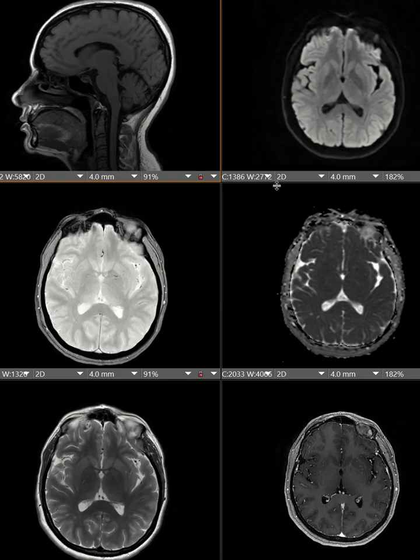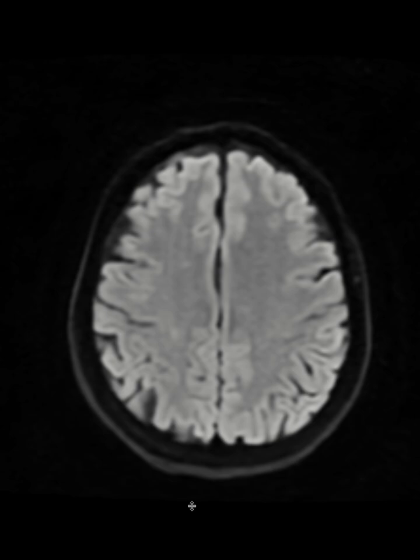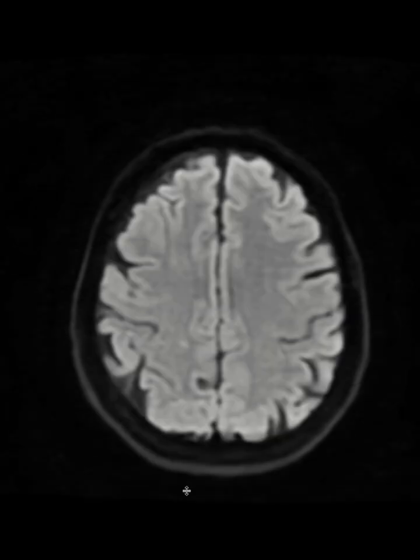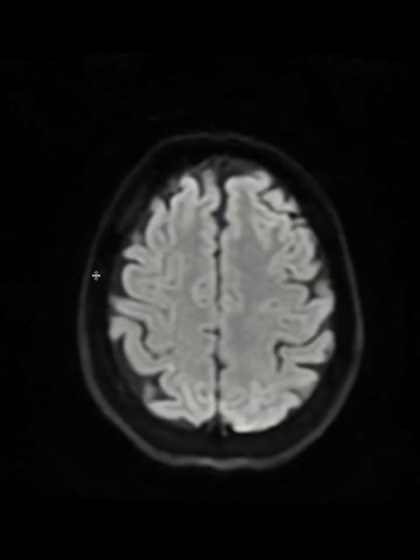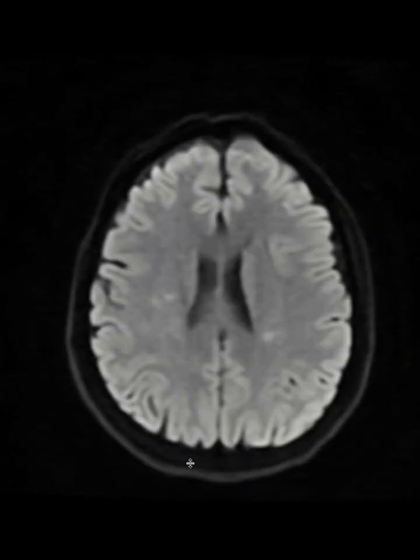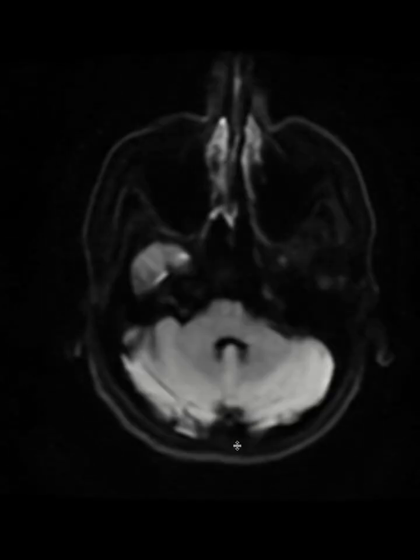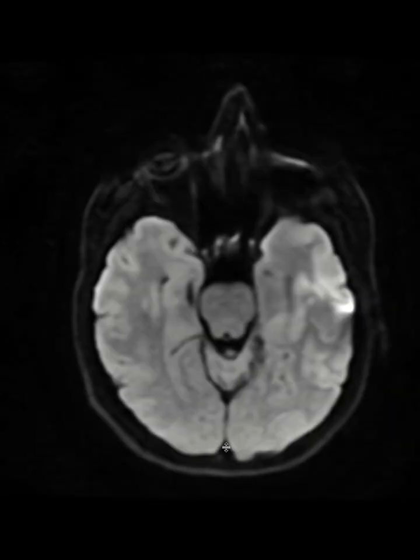Okay, let's look at this DWI sequence. It's interesting because I just encountered this with some of my residents. They were asking how you differentiate DWI from other sequences. Maybe for a more junior reader, it's difficult to differentiate DWI from other sequences. But if you look at it, the outside soft tissues are not very well seen. Mostly you see the brain parenchyma, and it's not a very clear sequence, as you see. So basically the outside is not very well recognized. That's how you know this is the DWI sequence.